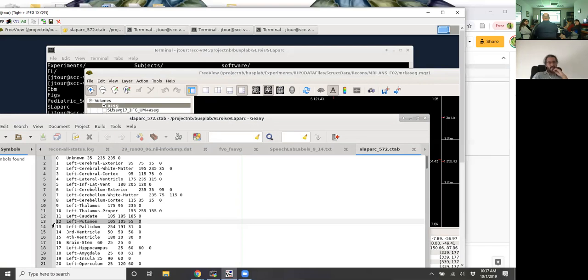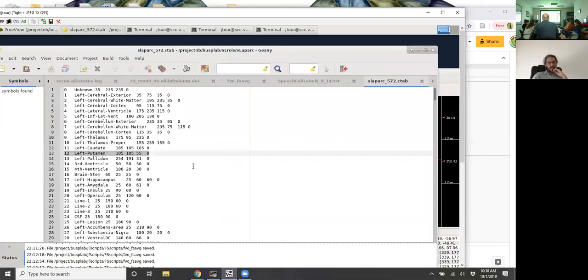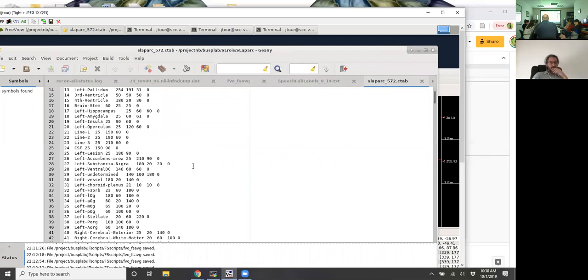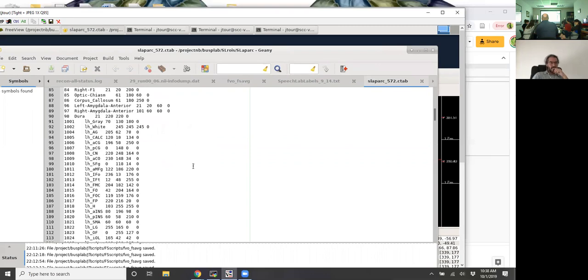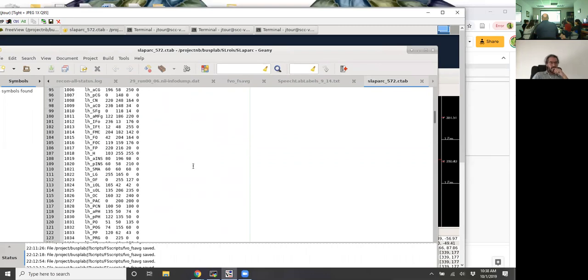And there are certain rules where I think it's like subcorticals, segmented subcortical regions are given values up to 100, and then left hemisphere cortical ROIs are given values starting at, I'm sorry, not up to 100, up to 999.